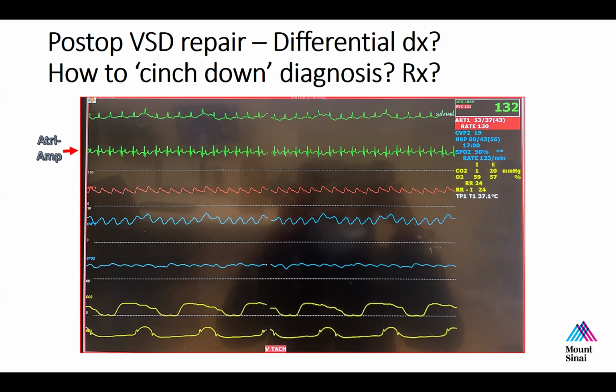So why don't we ask Dr. Mukhopadhyay what she thinks is going on here? Good morning, Dr. Paz. I'm looking at the tracing, and just so you know, the top is lead 2. The second channel is the so-called atriamp channel.